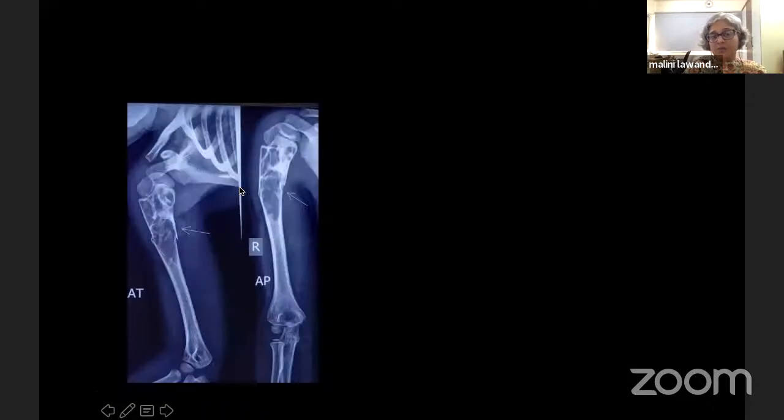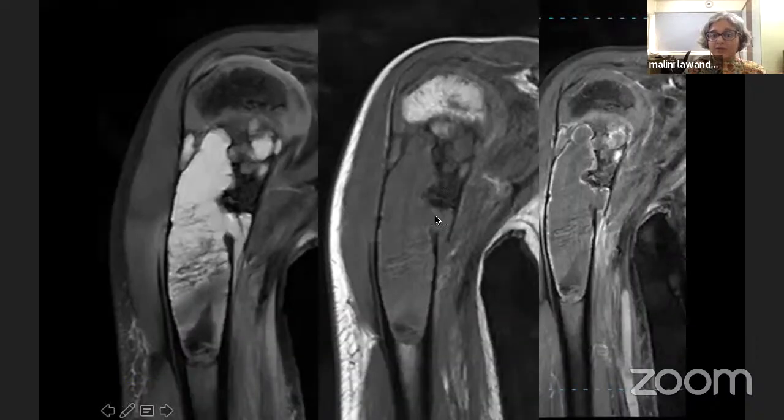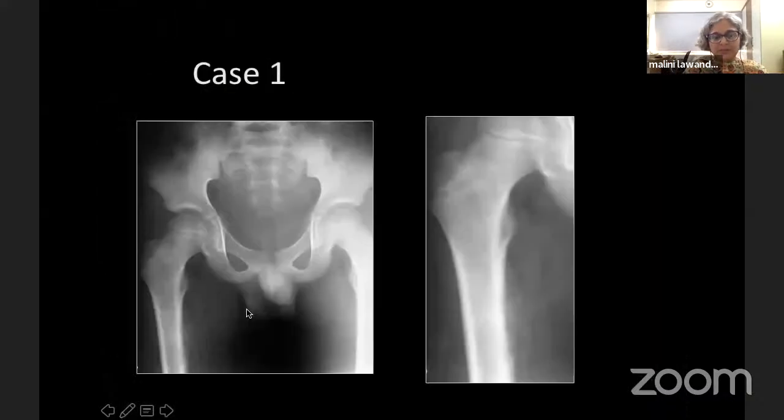Another lesion now looks a little more trabeculated. There's a pathologic fracture. Again, because of the fracture you have hemorrhage, but otherwise this is still a simple bone cyst. You have just simple peripheral enhancement. This heterogeneity is because of the hemorrhage. So you can have these atypical appearances of SBC, and one may do an MRI to confirm it.